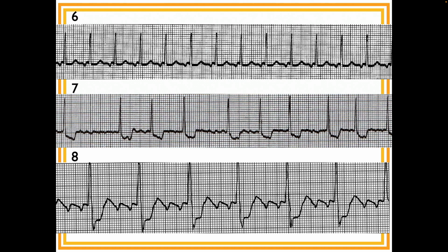If they're retrograde P waves, what does that mean, based on what you know now? Where do you think the rhythm originates? It would be junctional. Why is it impossible for this rhythm to be a junctional rhythm? Oh, junctional is regular. Bingo. You have to put it all together, shuffle through all the facts and say, well, what makes the most sense? Well, it can't be junctional for that reason.